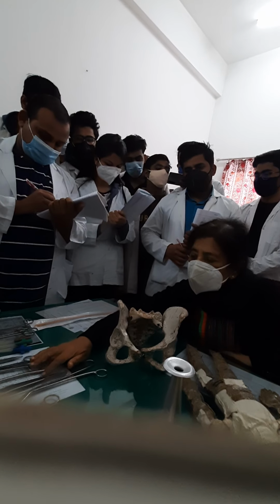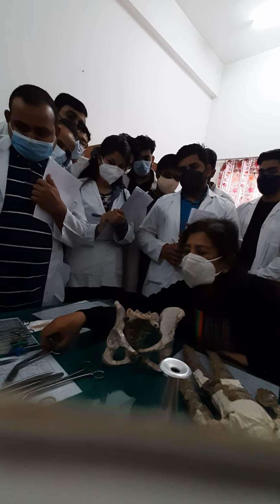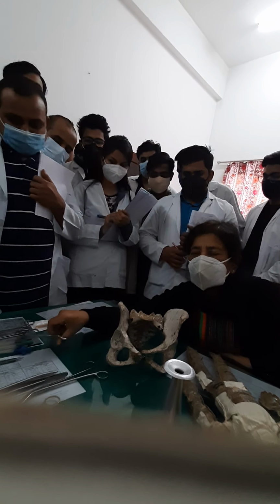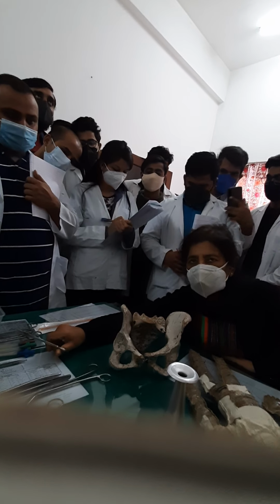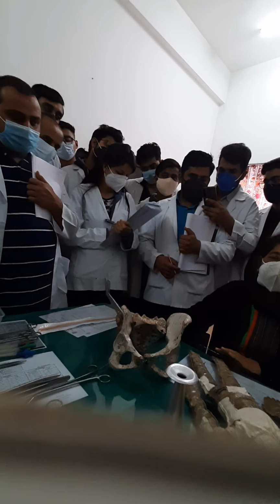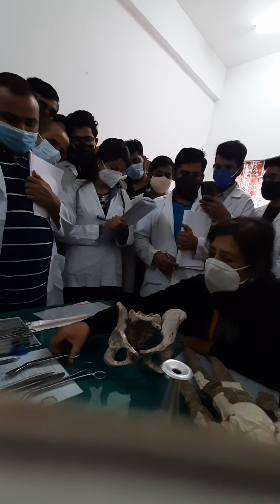This is forceps, and again dilator for gynae, no? And this is episiotomy scissors, okay? What is episiotomy? You have to know what structures are cut in episiotomy, which is the most common episiotomy given, what is the complication of episiotomy.